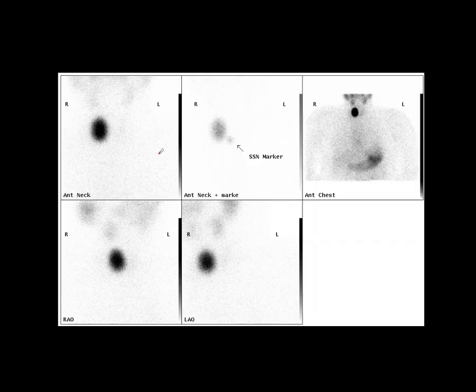And here we are again. Here's our anterior neck view, a spot view of the neck. And clearly this is not the same as we saw a minute ago. We're completely missing a left bow tie. And this one here is very fat and intense, so it looks like there's quite a lot of tracer there. You'll sometimes see this SSN marker and a little arrow. This is a suprasternal notch marker. It's just an anatomical localizer the technologists have put on for you.